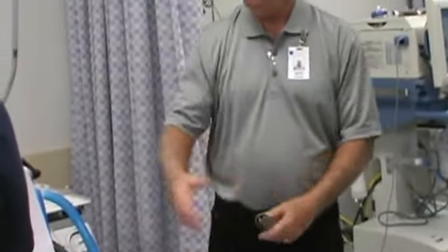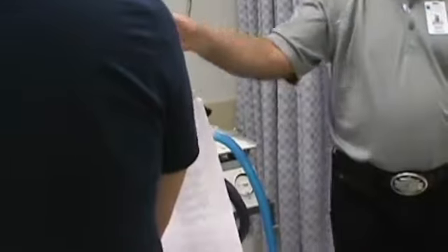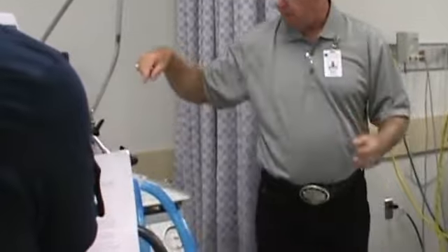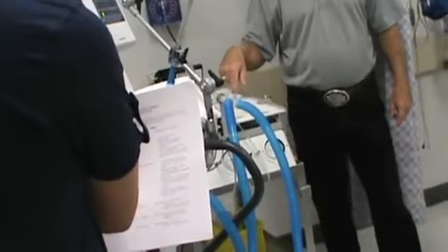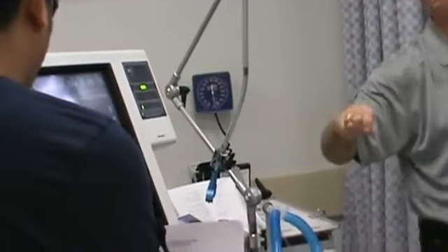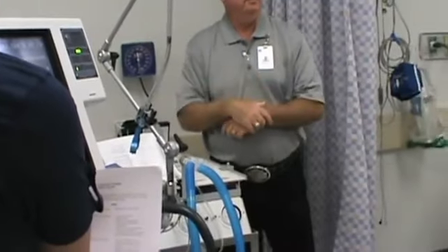Physician comes up and says, holy cow, we're giving 10 times what we need or whatever. And you say, well, not really. We're only ventilating at that same pressure, meaning that 15 centimeters of water pressure is what it takes to put 600 cc's into this airways resistance and compliance system, wherever it's at. So if I go back and lower the tidal volume with added flow to achieve this 15 centimeter water pressure, 600 cc's is what went into the patient to generate that pressure.